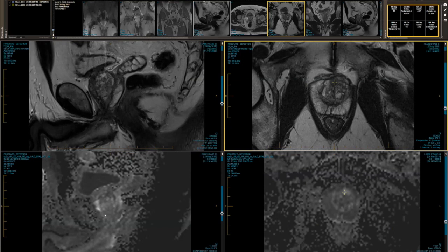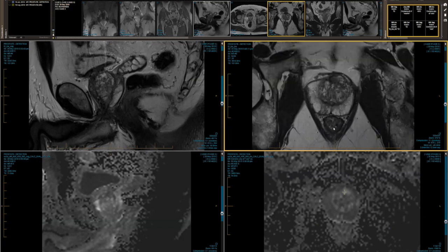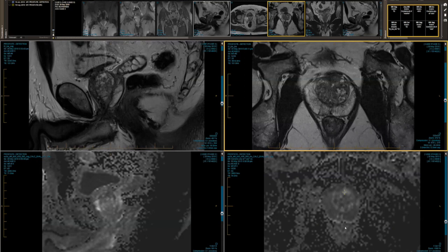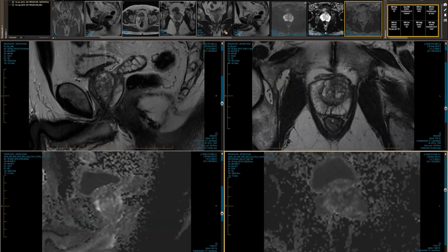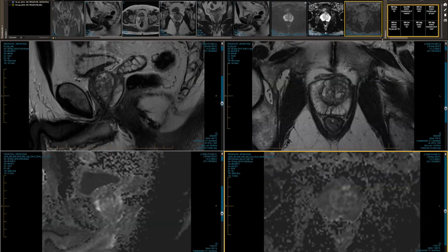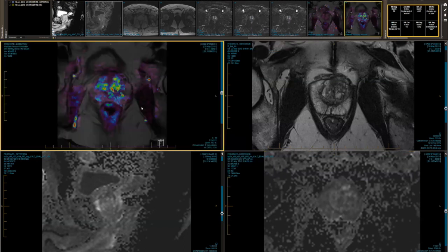Most of the mid prostate. The ADC I've got measured there at 800. So I think that's a PIRADS 4 lesion. But if we go through the peripheral zone, there's nothing on the T2s on either side or on the high b-value. Or if I can just bear with me, I'll just show you this is the contrast. There's nothing really on the post-contrast.